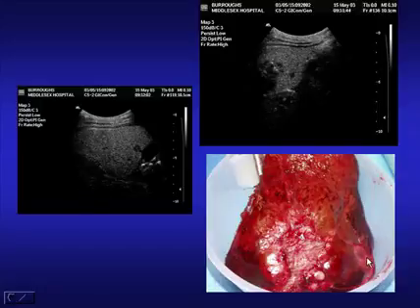And this is what I mean by a satellite lesion. Here is a large colorectal cancer which has been surgically excised, and here you can see a sub-centimeter lesion. It is about 1 to 2 centimeters away from the main tumor mass. And colorectal cancer metastases spread through the liver largely by invasion of the vascular spaces and can grow along blood vessels and appear as separate metastases within this halo of 2 or 3 centimeters around the main mass.